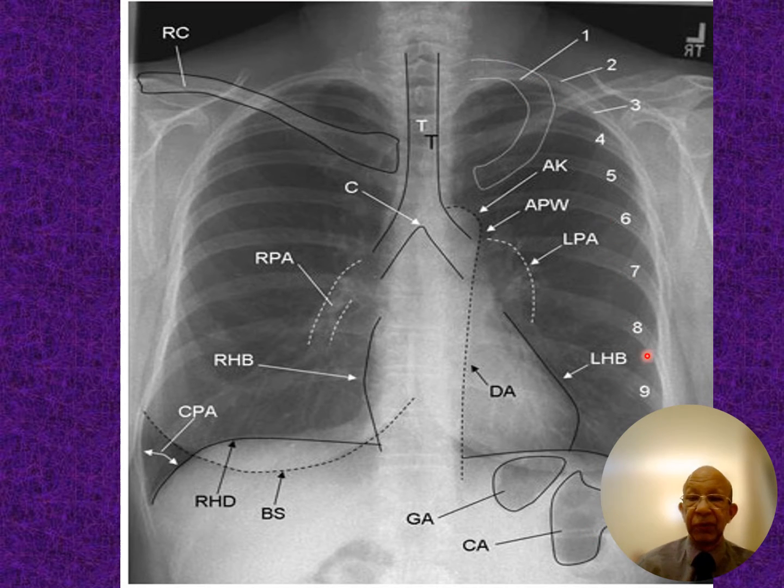And you should be able to see the ninth or tenth rib posteriorly on a good X-ray with good inspiratory effort, unless a patient obviously has a restrictive lung disease, when you can probably not see the ninth or tenth rib posterior aspect.